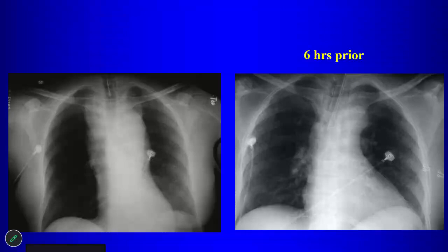The mediastinal widening. Yes, notice all of this mediastinal widening, and a clue that it's often real is that you could see the aortic knob before and now you really can't see it. It's obscured now.